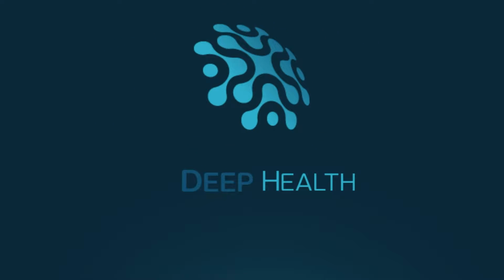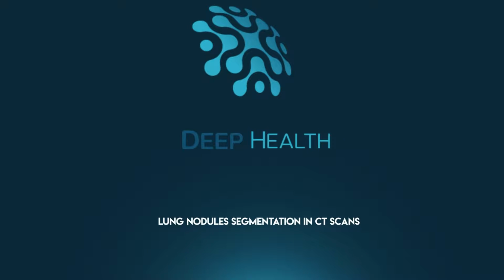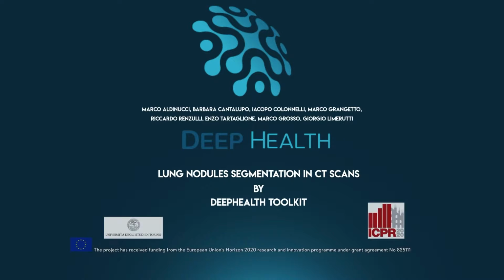In this demo, we will show how a deep learning pipeline can be executed on a hybrid HPC cloud infrastructure, OpenDeepHealth, which is available at the University of Torino. We will use the deep learning libraries and tools developed in the DeepHealth project. The pipeline's goal is to train a model to recognize lung nodules from chest CT scans.